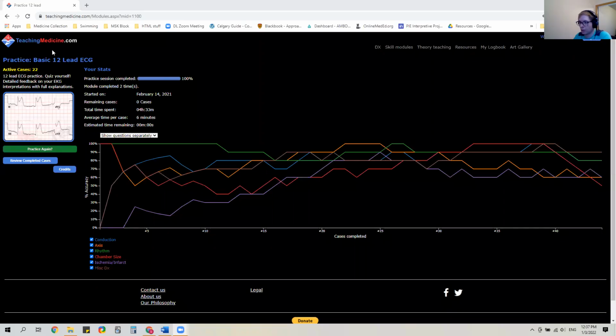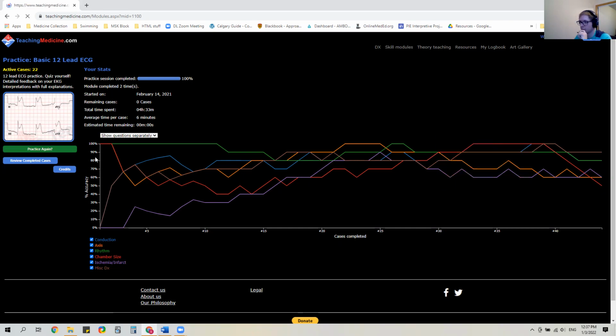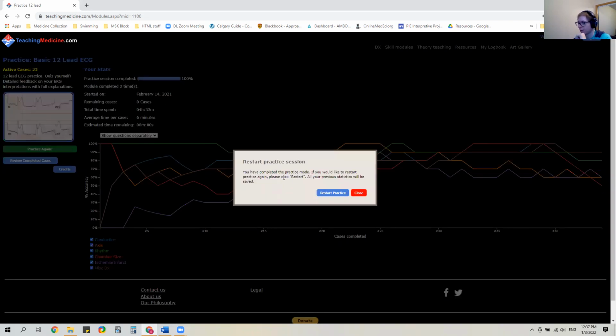I'm going to make sure that I'm sharing the correct screen, so just share screen again. All right, if you go into teaching medicine, and hopefully you have this year, you go into skill modules, click on ECG, and then you have all these tutorials. At the very bottom, it says practice basic 12 lead ECG. If you click on that, it'll take you to this page right here. I've already gone through it all once before, but I'm going to start from the beginning. So, practice again.